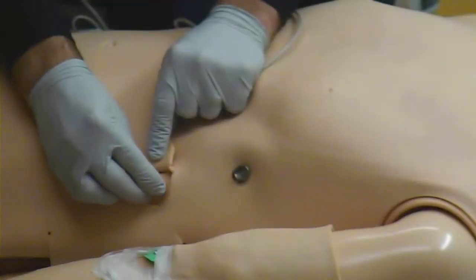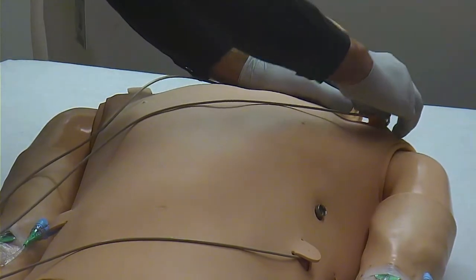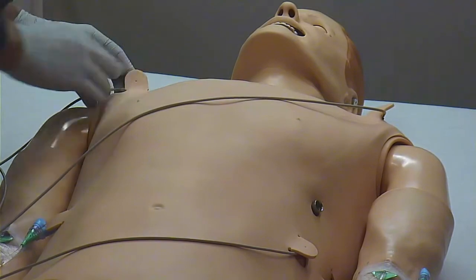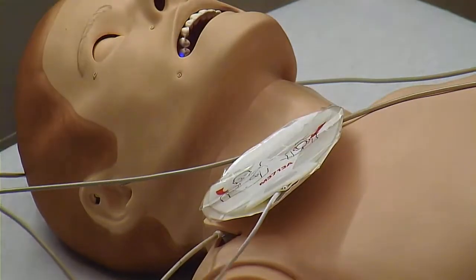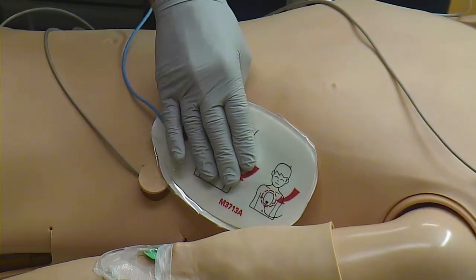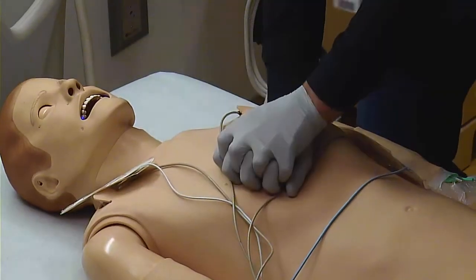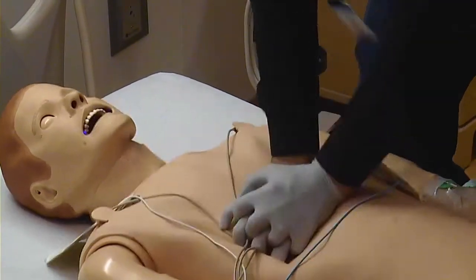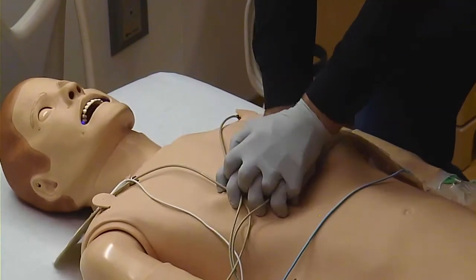Defibrillators can be used with the patient simulator. ECG leads do not need stickers to attach. The Manikin has pre-placed connection studs where a 3-lead ECG can be placed. The same is also true with defibrillator pads. Pads will snap onto the mannequin. These pads can easily become disconnected, especially while performing compressions. If you notice one of your pads come off during the simulation, just snap it back on.